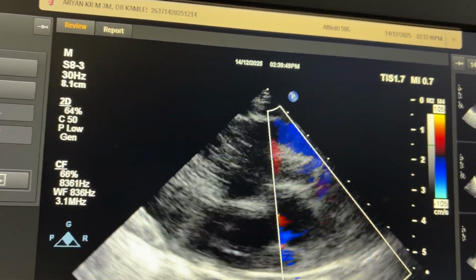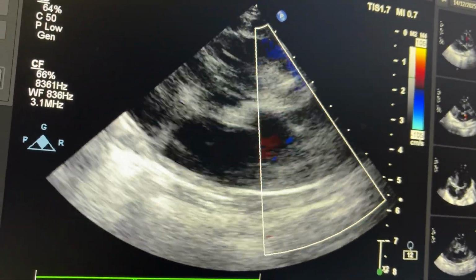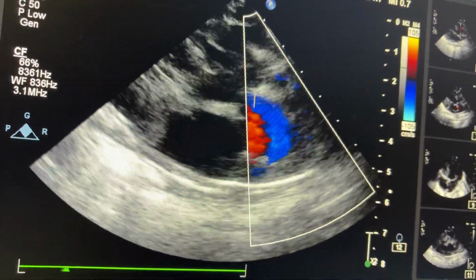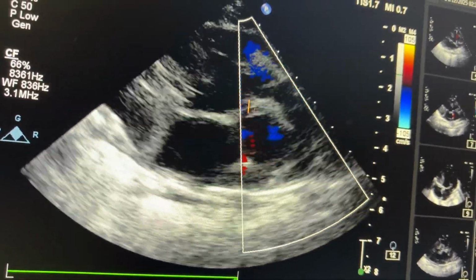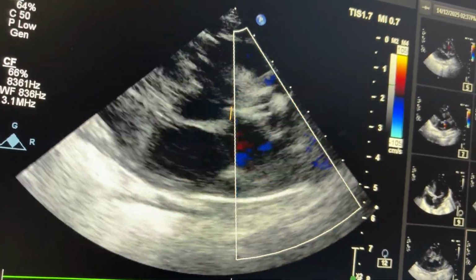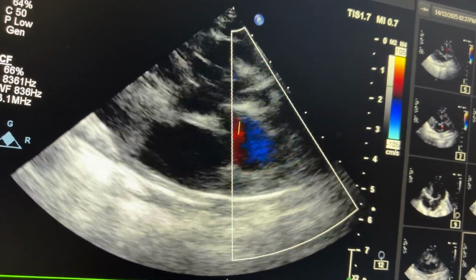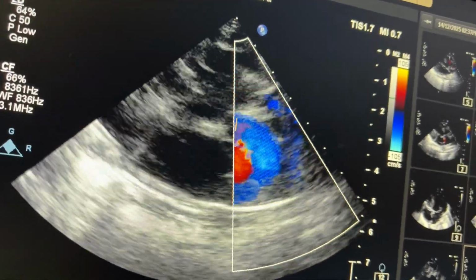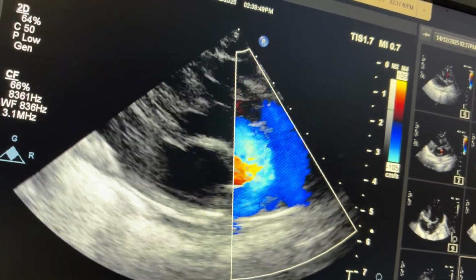So whenever pulmonary artery arises from left ventricle, in the initial part it immediately goes posteriorly. So that is the finding. Whenever you find great artery starting from left ventricle and going posteriorly immediately in initial phase, that means it is pulmonary artery, that is in transposition of great arteries. So that is the finding that you have to note. That is also being said in my previous video.